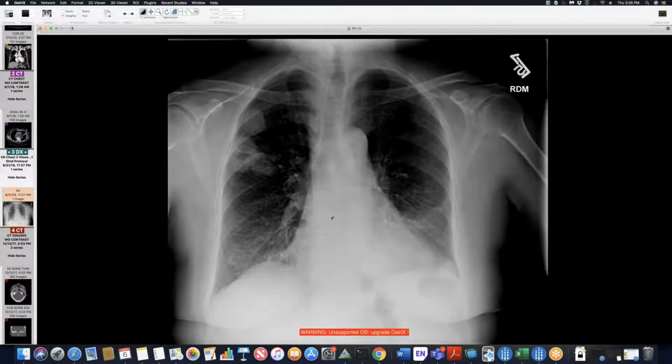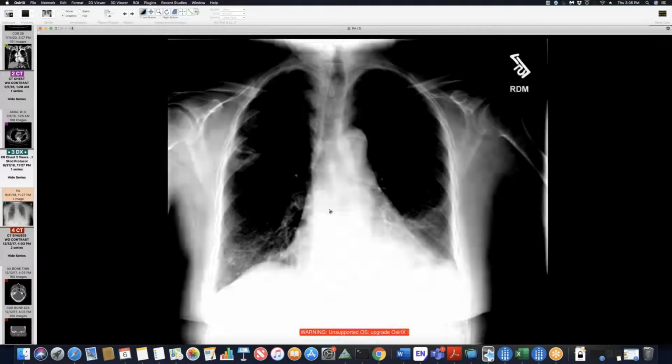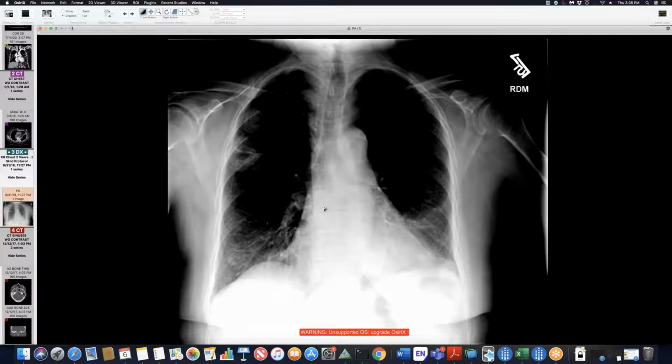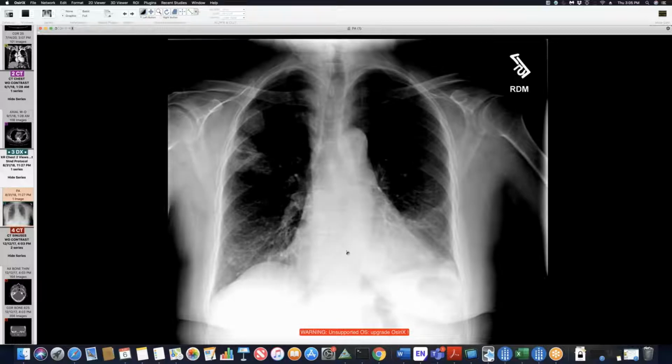And another subtle thing is, and I'm not sure if the imaging resolution on the images that are transmitted is good, but yeah, we can see it. The azygoesophageal recess, there's a little silhouetting right there, and then another little subtle thing right there. So a bunch of nodules, just to see them on the X-ray for practice.